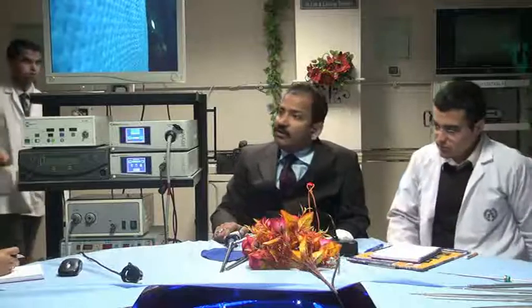So this is the first property of the telescope, that is white balance. After that you have to do it. I've seen some surgeons who prefer to do white balance inside the peritoneal cavity. No, this is actually absolutely wrong. If someone is doing white balancing inside the abdominal cavity, then where will you find the white color inside the abdominal cavity? And if it was showing the yellow color, it will remove the yellow color and add the counter color for yellow. So they have to change their habit.